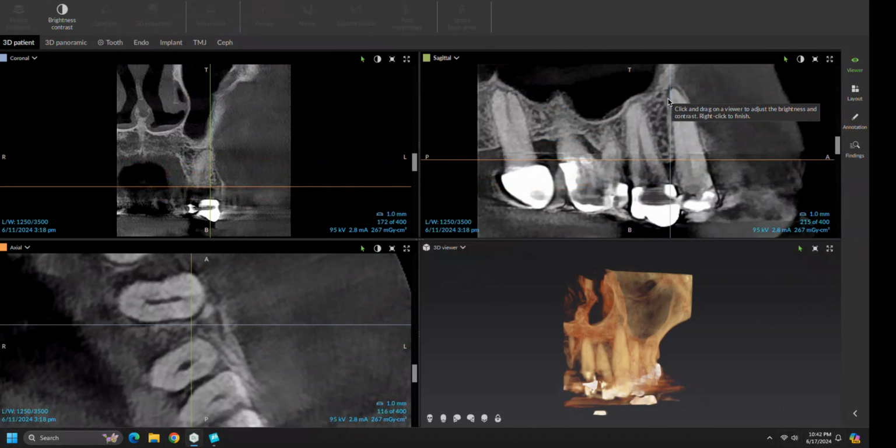And this kind of uniform look around the root tip, which I see in the sagittal view but also in this transverse view, is rather uniform, which gives me a sense that this tooth was under a certain degree of occlusal microtrauma over time. It would make sense that an upper premolar, a common tooth to fracture in an oblique way when the occlusal trauma is high, is corroborated by the fact that this tooth appears to have been under this microtrauma over time.